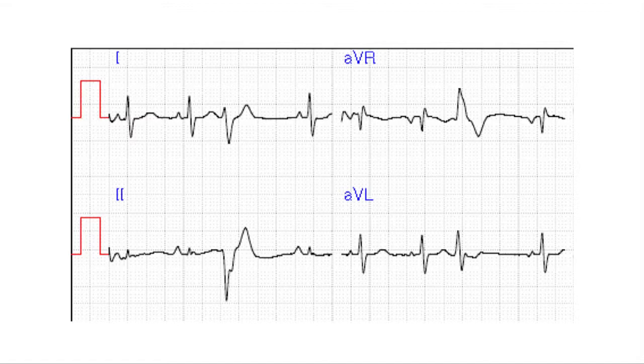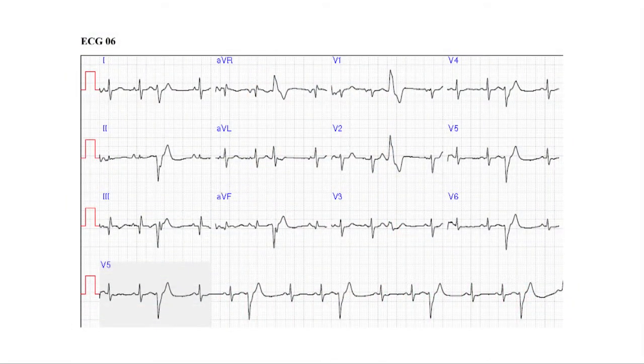It's always worth doing an ECG if somebody complains of palpitations or a sensation of a thump in their chest. If you see 1 ventricular ectopic, it really doesn't mean anything. It's a normal variant. Ventricular trigeminy itself, again, apart from it meaning there's a lot of ectopics happening, doesn't really mean anything particularly. So you can have ventricular trigeminy, have no symptoms, and have a good prognosis.